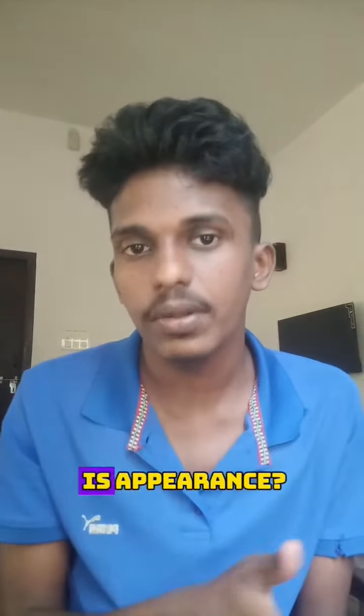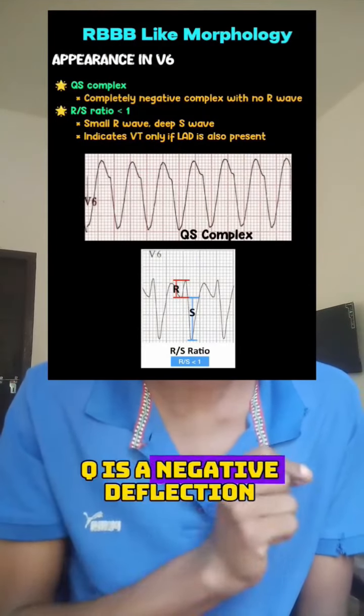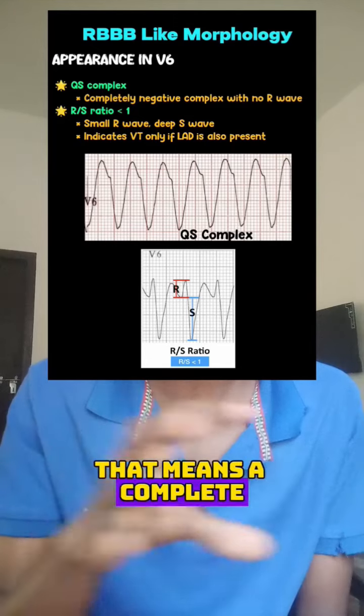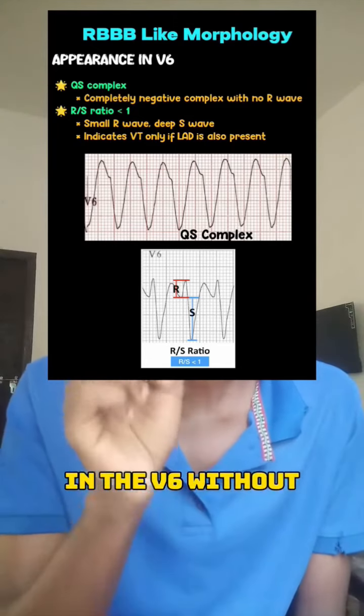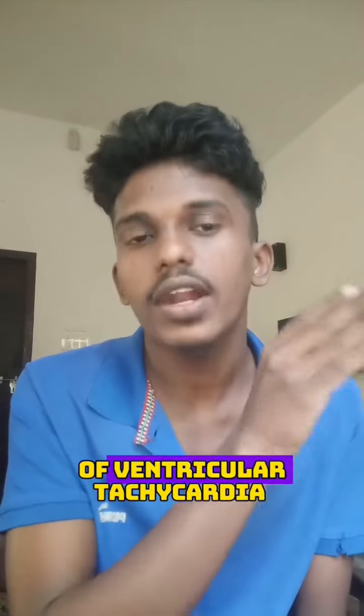Now in V6, what is the appearance? In V6, there is a presence of a QS complex. Q is a negative deflection, S is a negative deflection, that means a complete negative deflection in V6 without the presence of an R wave. That is indicative of ventricular tachycardia.